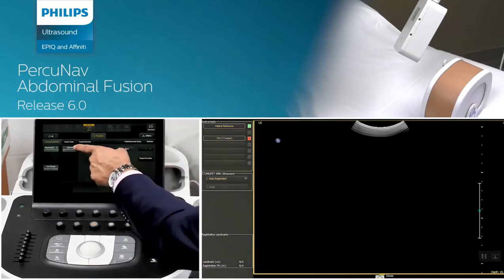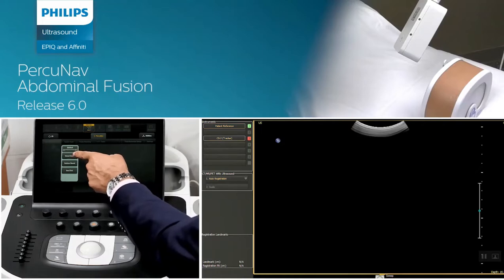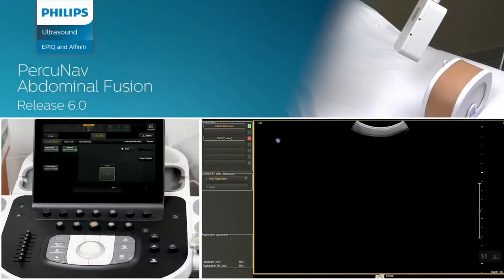You can select vessel-based or surface-based method depending on the image series loaded. Vessel-based works best with contrast CT that are venous, portal, hepatic, and potentially late phase. For MR datasets, vessel-based works best with the T1 series.